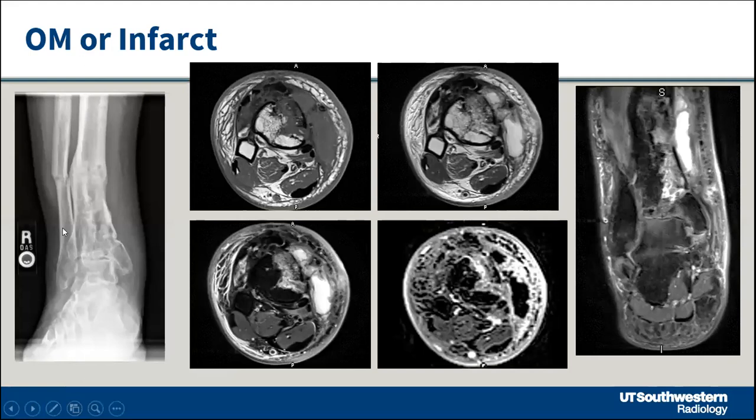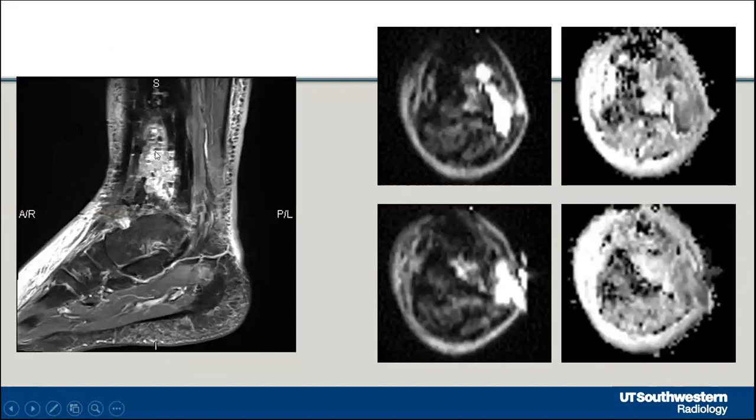Now, here's a case of osteomyelitis versus infarct. So here, obviously, you have bone destruction. You have a collection there. And this looks very patchy. You know, is it something else or is it osteo? So if you look carefully, it looks really weird. There are some metal artifacts also. If you look at on diffusion ADC, there are two different things happening here. This one is abscess. This one is not restricting. It's a bone infarct. And the abscess sort of reaches there, but this is not infected. So they can basically drain it out and scrape that portion.